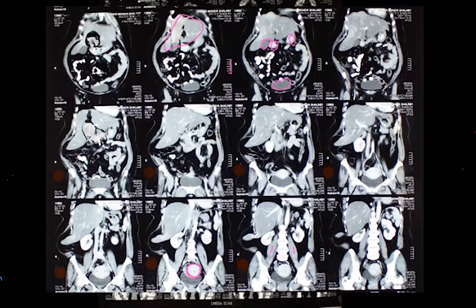Develop a method to comment on the CT: the parietes, the liver, the spleen, the urinary tract, the peritoneum. How about the parietes? What's going on with the parietes? Look at the parietes. Is there weakness, or swelling? Is it a simple weakness? Go on to the lower row. Look at the lower row. No, there's swelling. And if swelling is a clinical term, you cannot call it a swelling. What is there?